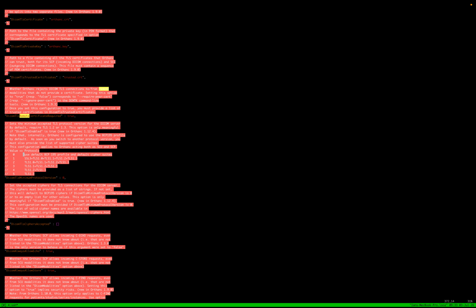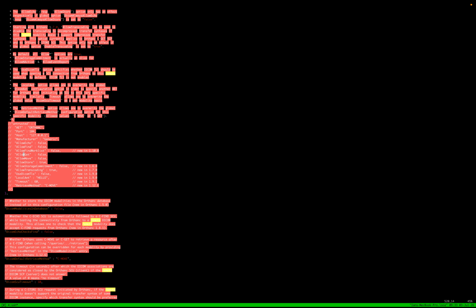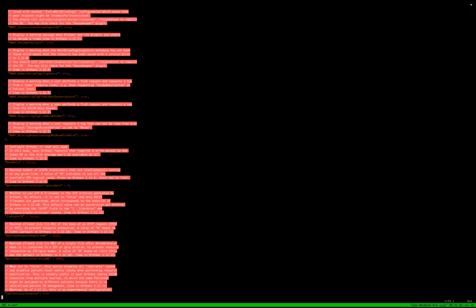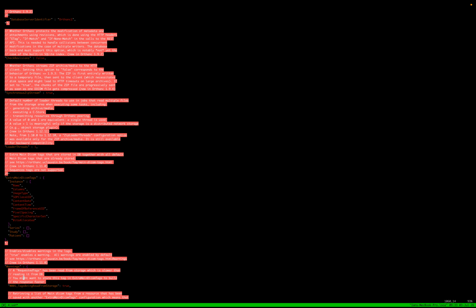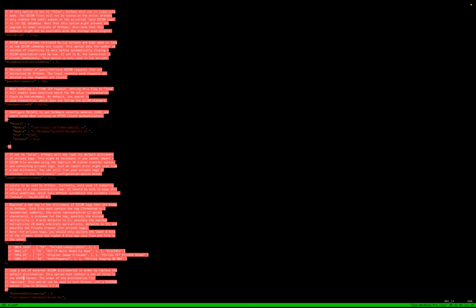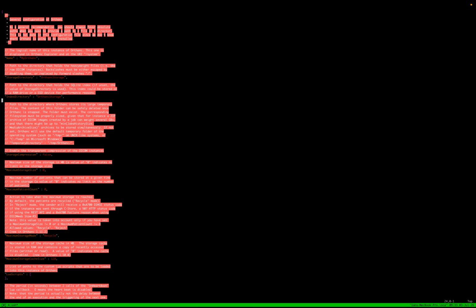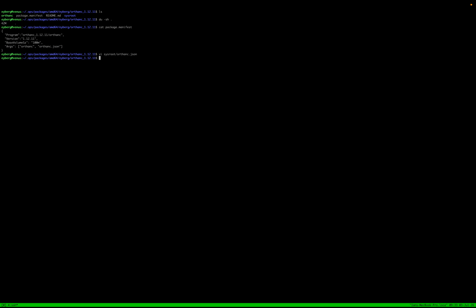As you can see, there's a lot of various configs that you can put in here. As a follow-up task, I'm going to have to wonder how they have these comments in here. But as you can see, it's pretty infinitely configurable. The rest of this, I added the local time. It wanted that, and that's about it.